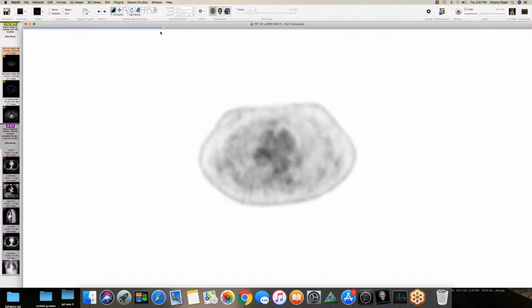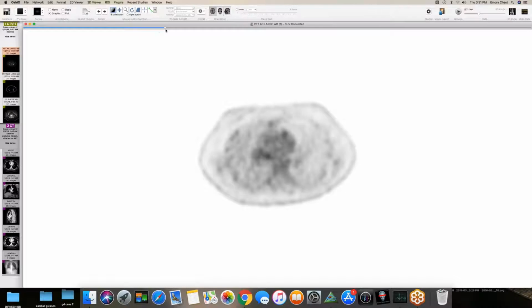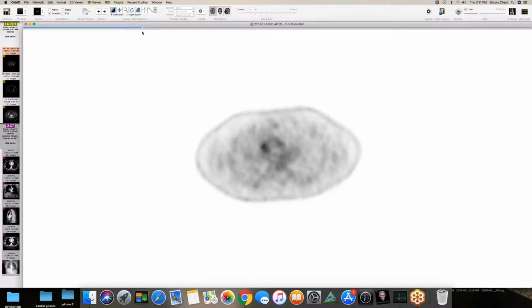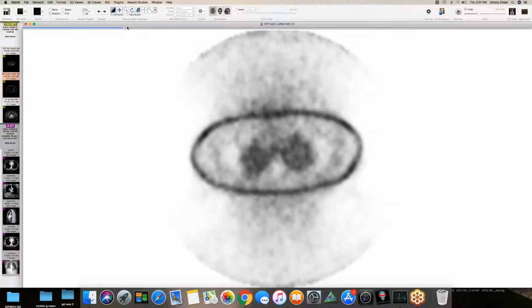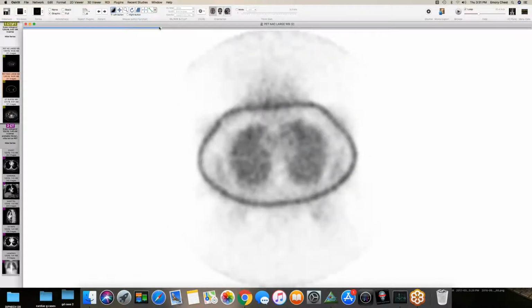Why did they do the PET, Brent, just to confuse everybody? It was called cancer outside. Okay, so on the outside it was called cancer. And the non-attenuation corrected still shows activity. It's not just calcification that's fooling us. I agree with David though. I think you're allowed to have some inflammation and ongoing metabolic activity.